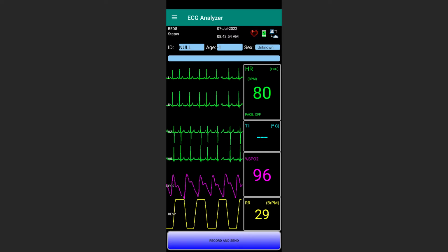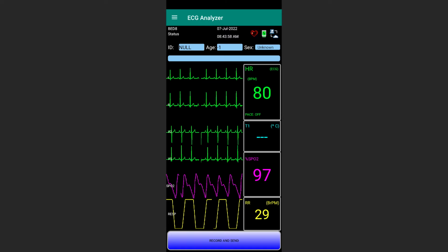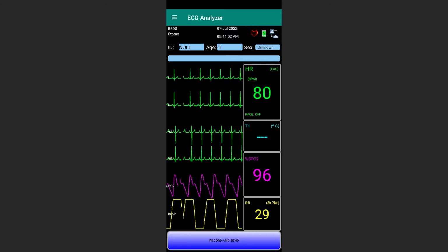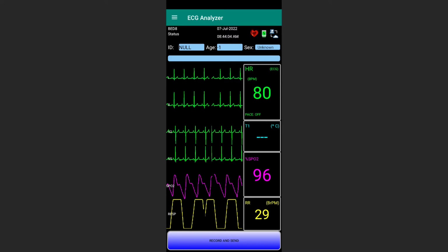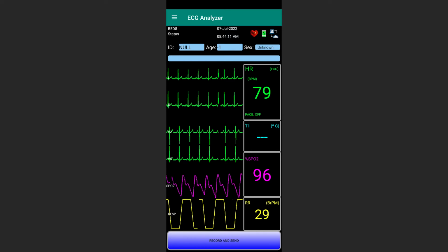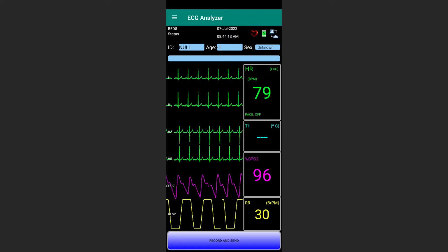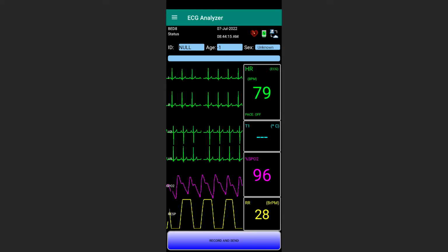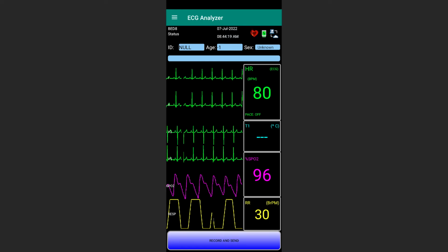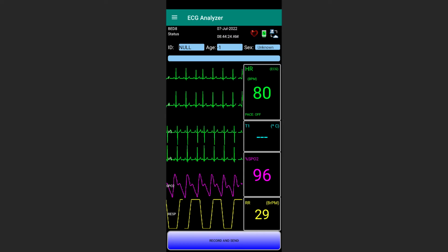One of the most important abilities of the app is to send SpO2 and ECG signals in real time to the server. This data will be processed by an algorithm named Glasgow to report the heart health of the patient in a short amount of time. This report will be very useful for ordinary users and even cardiologists. The main goal of this app is to accurately assess the patient's heart health in the shortest possible time.